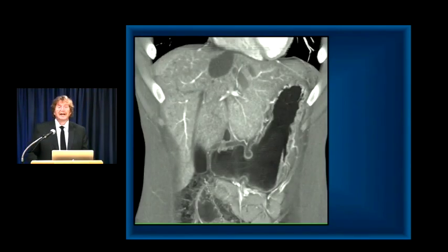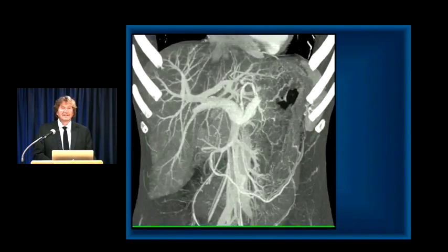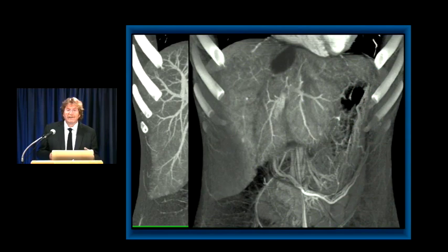Now, sometimes it's kind of tricky. You look at this lesion in the liver. This is a 20-ish-year-old, had fever. We saw this. We were doing a workup to rule out anything. Couldn't explain the fever. And I saw this lesion. It's kind of low density and well-defined, but I agreed when I looked at it and looked at the vascularity, it wasn't a simple cyst, but it didn't look like a metastasis. It's well-defined, but it's about 40 Hounsfield units. I thought about an abscess just because the patient had so many different symptoms.